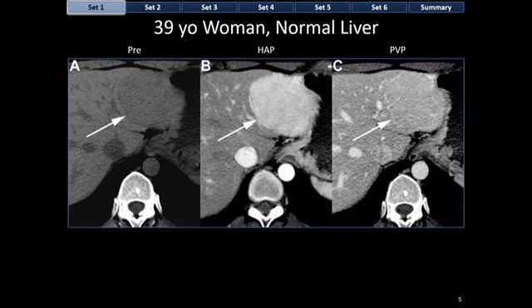Notice, especially importantly, that in the portal venous phase, this mass virtually disappears. And if you only had the portal venous phase, you might imagine on a busy day, you might go through that image and you might actually miss that mass entirely. So hold on to that, the mass that disappears in the portal venous and delayed phase. This mass has no capsule, no areas of necrosis or heterogeneity, and although it can be tough to see on CT, no obvious fat. So those are the descriptors.